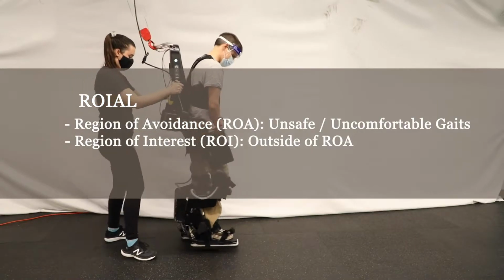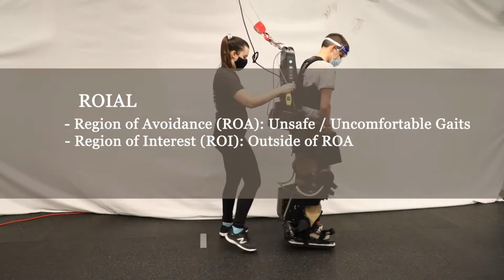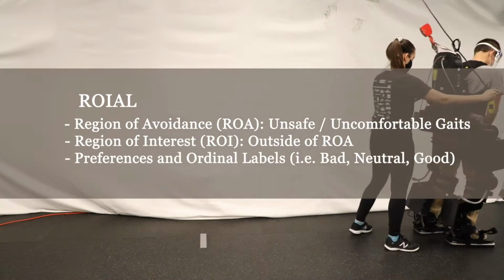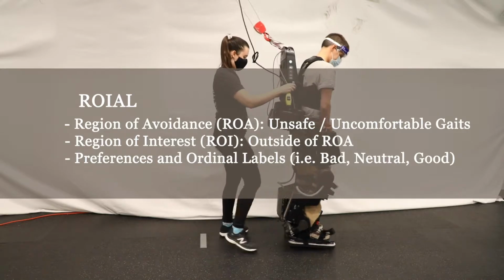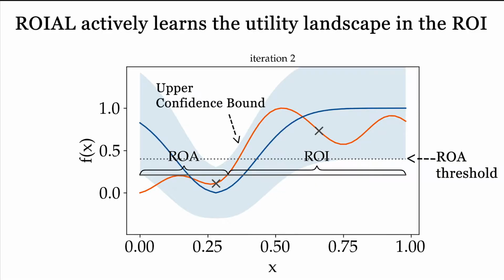ROIAL identifies a region of avoidance containing gaits that make users feel uncomfortable or unsafe, and focuses learning within a region of interest outside of it. ROIAL learns from pairwise preferences and ordinal feedback, which assign gait trials to ordered categories such as bad, neutral, and good. First, we'll illustrate this learning process on a one-dimensional example.